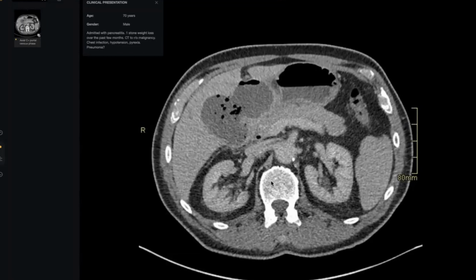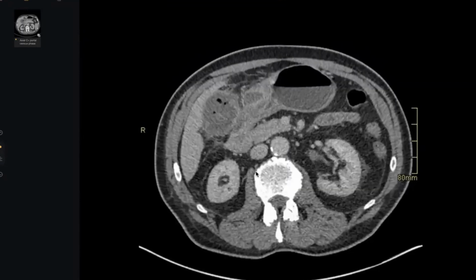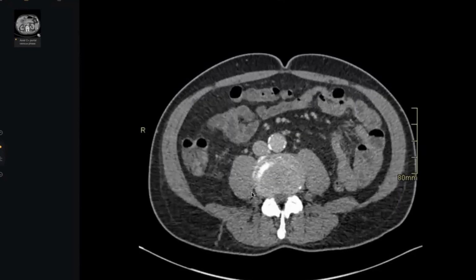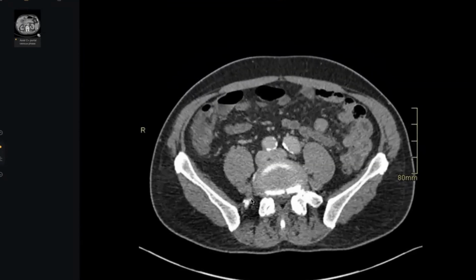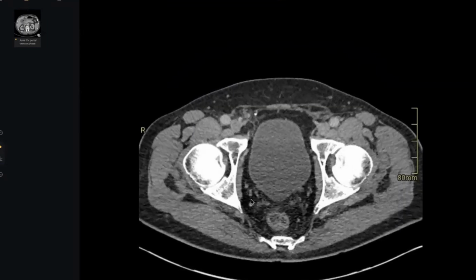Yes. 70-year-old male patient presented with acute severe abdominal pain. I'm presented with CT scan axial sections of the abdomen in the portovenous phase. First, I'd like to go through the images and I will start describing my findings.